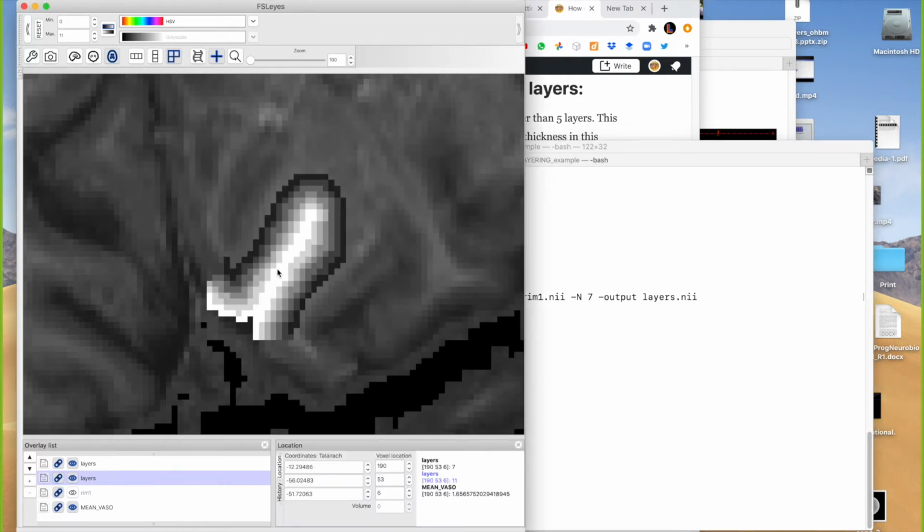So now we have these layers directly in Nifty space of the voxels, and we can easily just average the signal, the T1 signal or the Vaso signal or the bold signal, for each group of voxels, like for each mask, for each value in these layers.